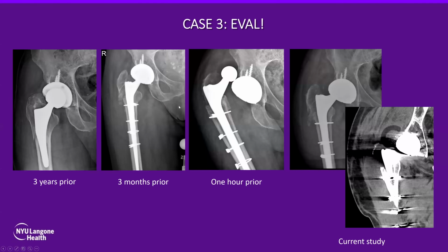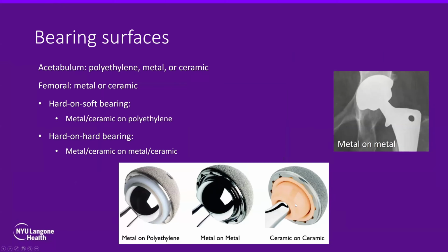And if you're asking me what this finding was, this patient had this arthroplasty 3 years ago. They fractured the proximal aspect of it. So they revised the arthroplasty. They put some cerclage wires here. And this is basically callus formation related to that old fracture. And the rest, we know.